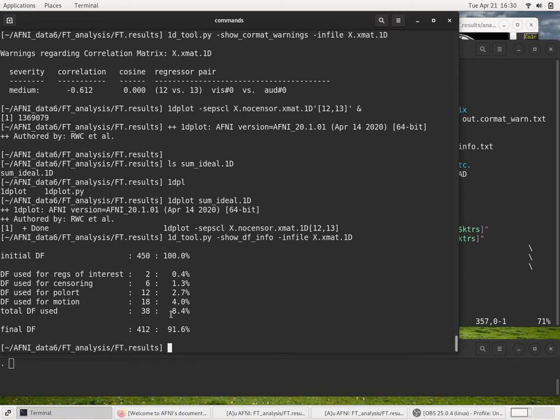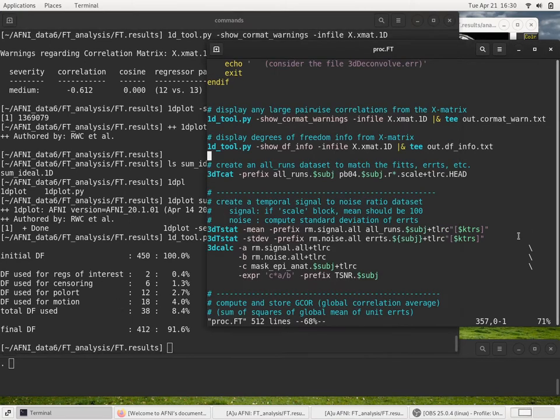And then you can see quickly that if there's any motion censoring, you're going to be right near 0 remaining degrees of freedom, or in some cases it will fail because you've gone negative in some sense. You've got more regressors than you have time points remaining after censoring. But we have tasks, and even some people that have resting state aren't band passing, so that's not a problem.